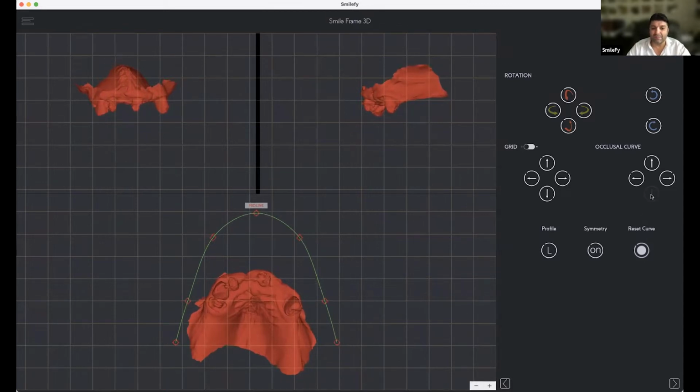That's why, depending on how visible the landmarks are and how well you can set the points on the STL and on the picture, otherwise the only way is to adjust everything and do the calibration manually.